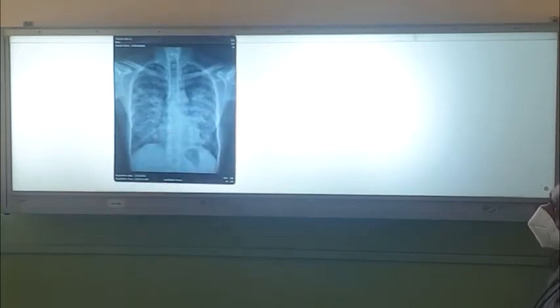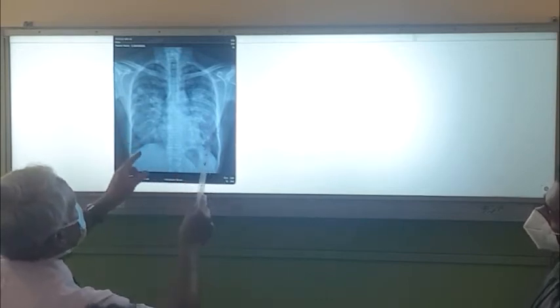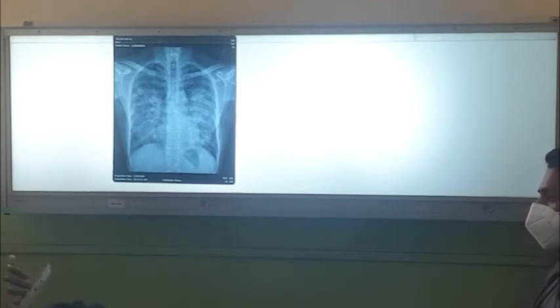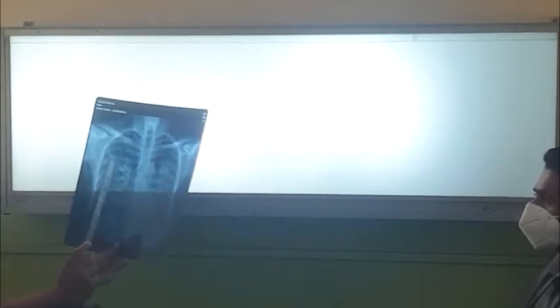This one was transferred from the mother. Now we can't see the cardiac borders, perihilar reticular nodular opacities are there, right? When you see this, think of pulmonary edema, think of atypical infections like pneumocystis, right? And the other thing is, we have to always think of lymphangitis carcinomatosa, so lymphatic spread of malignancies. We have to examine and see. So there are a lot of lymph nodes, FNAC showing adenocarcinoma. So it's a lymphangitis carcinomatosa, right? But we have to think of pulmonary edema, atypical infection, everything, right?